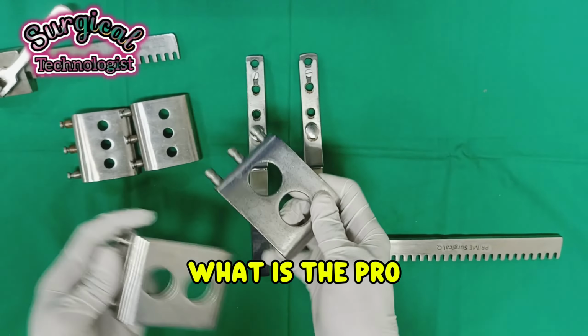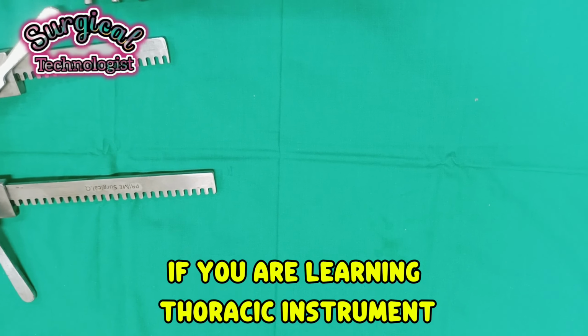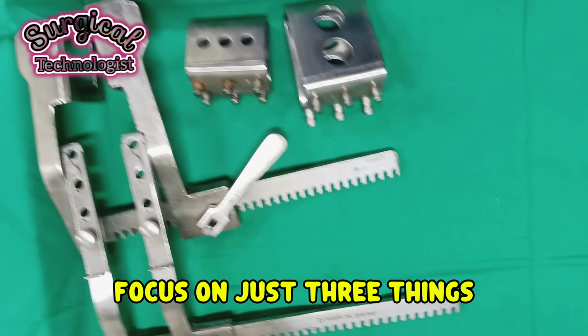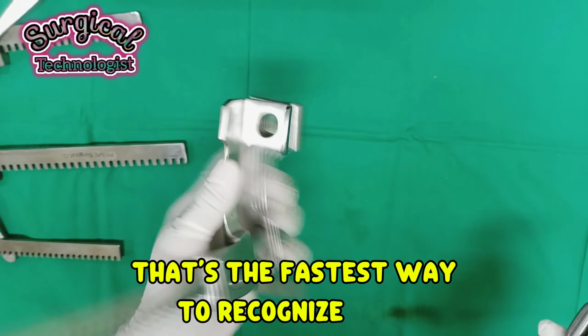What is the pro tip for remembering? If you are learning thoracic instruments, focus on just three things: jaw, shape, and locking mechanism. That's the fastest way to recognize them.